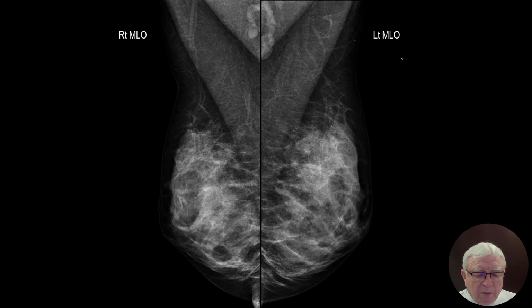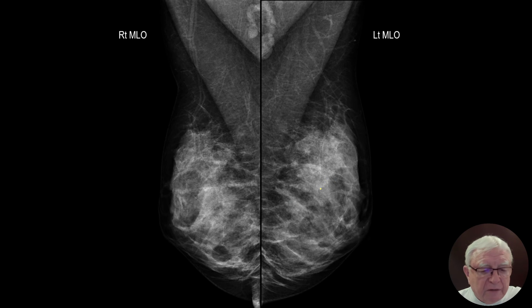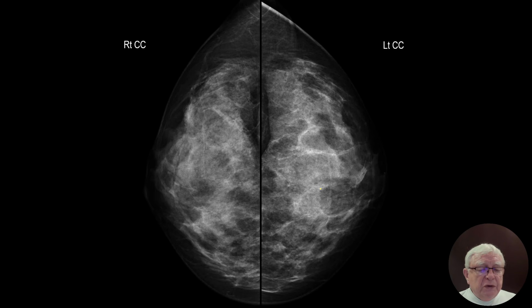This is the breast of a young woman. And once again, look at the black in order to see the white. And this is harmonious. As soon as the cancer is growing out of this TDLU, it's going to grow at the expense of the fat, or we are going to have the iceberg phenomenon or calcifies. I don't think I see much here. Would you say that there is something here? Not on the MLO. Tell me whether you would call her back.